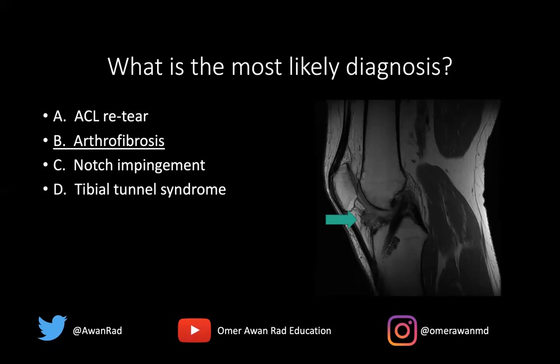It's not a case of intercondylar notch impingement syndrome because with that diagnosis, there's often an osteophyte at the intercondylar notch that exerts mass effect on the graft itself, resulting in impingement. There may be a chronic sprain or intermediate signal, even partial tearing of the graft because of that mass effect. We see no evidence of notch impingement here.